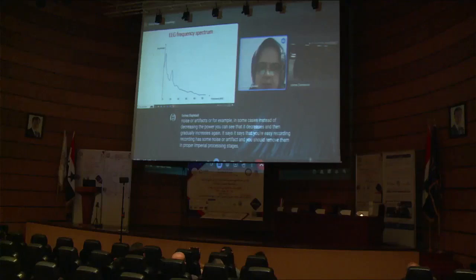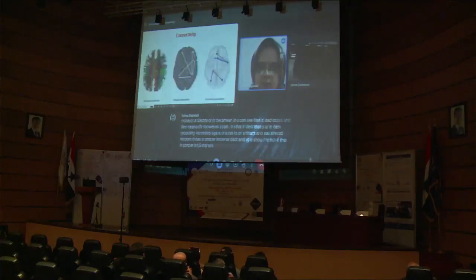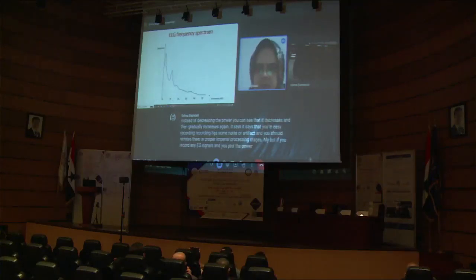But if you record an EEG signal and you plot the power spectrum and see something like this, it shows that the level of noise on your signal is very low, or maybe there is no obvious noise on your signal.